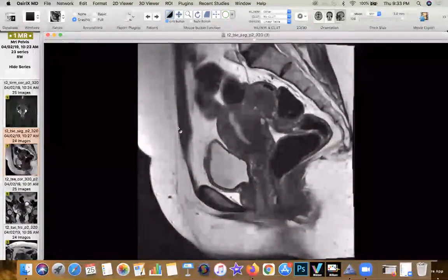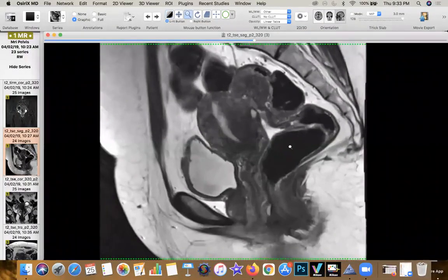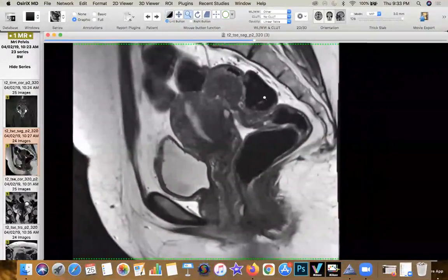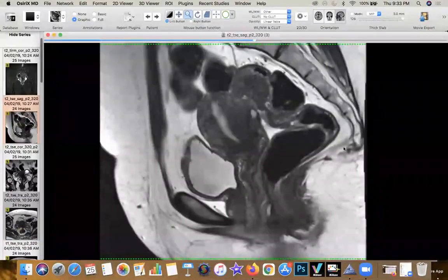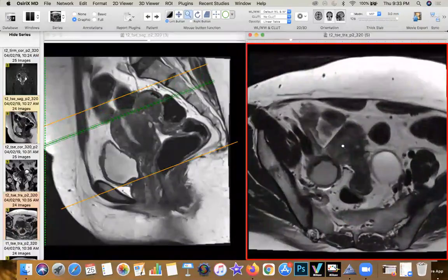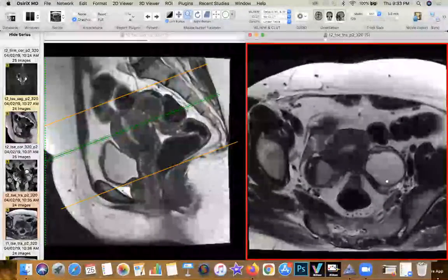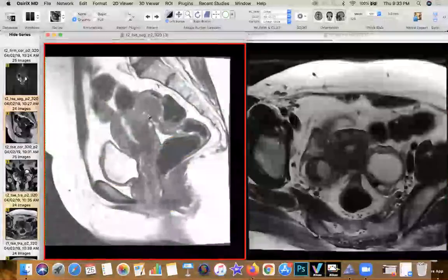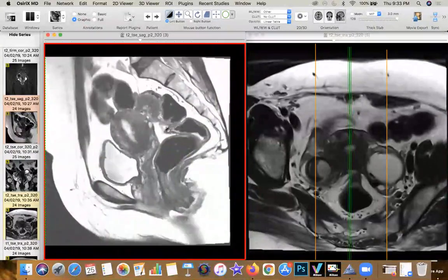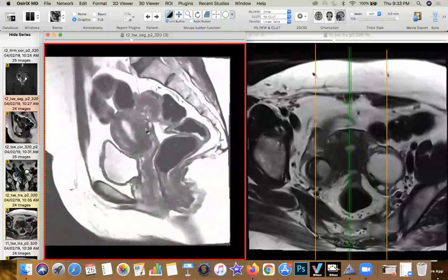And to our surprise and to our delight, we were pretty much right in the way we were thinking. This patient basically had a lesion in the anterior wall, but interestingly, you could see that on the T2 weighted images, axial, which are coming down from the fundus, there are two bulky ovaries sitting up here, the contents of which are pretty much sine qua non in imaging, which I'll start describing to you all. And as we also expected, we found that the lesion in the anterior wall of the rectum was tethered to the posterior wall or the posterior serosal surface of the corpus itself.